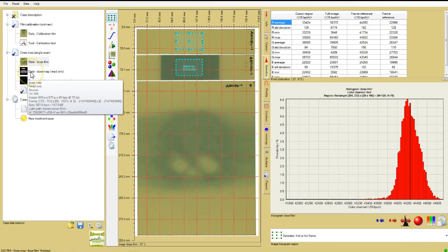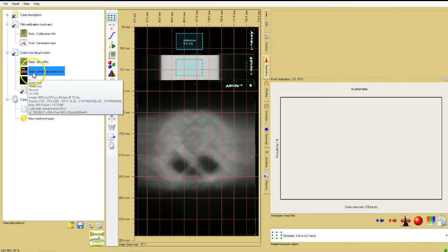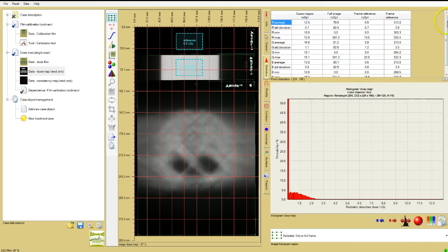Now look at the dose values for the exposed reference strip. It's 313 cGy in all three color channels. The reason the unexposed reference strip doesn't show 0 is because FilmQAPro resets any negative dose values to 0, so the values in the table are slightly positive, but statistically the distribution is correct.